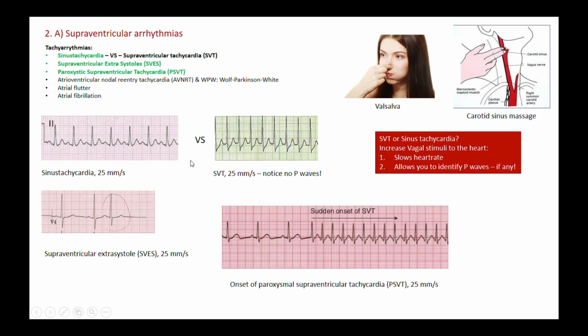Now, a supraventricular extra-systole, the second one here, is illustrated down on the left. This is just an extra supraventricular depolarization that occurs before its time, before it should, if you follow a regular pattern here. And of course, if this just happens once in a while, it is of no concern to the patient. There's nothing really dangerous going on usually.